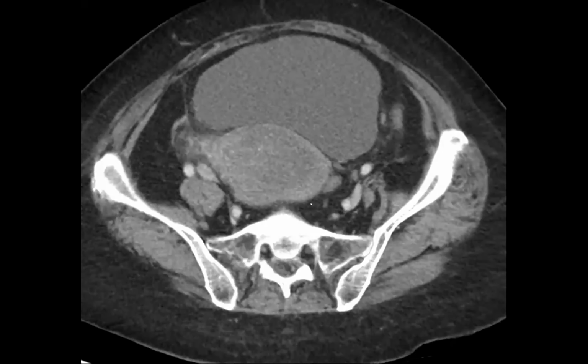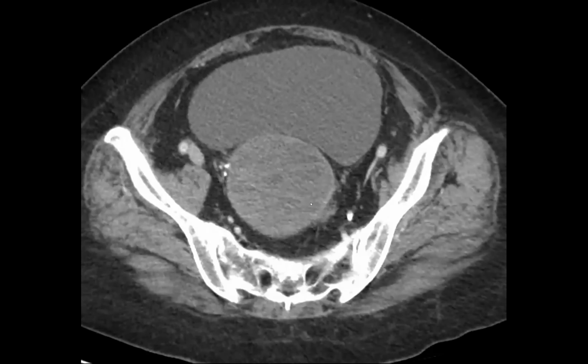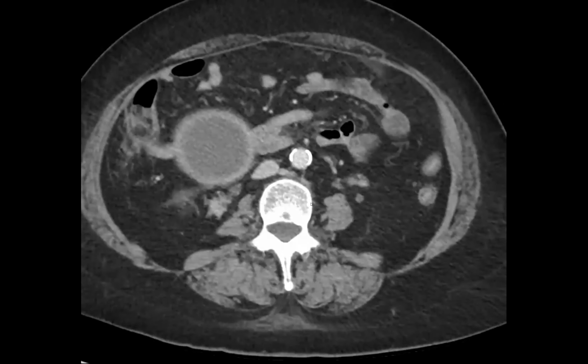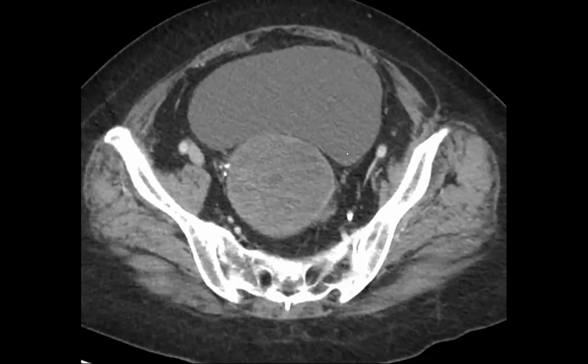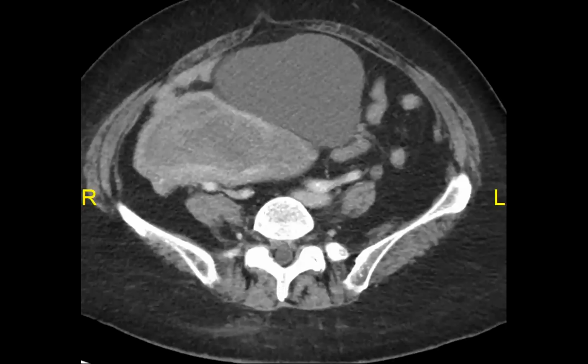Okay, let me show you. Sarcoma. There's an endometrial sarcoma version, I think it's called ESS. I forget the full name. Wait, wait, let's just figure out what's happening, okay? Before you jump to conclusions, I'm not saying you're wrong. Where's the cervix?